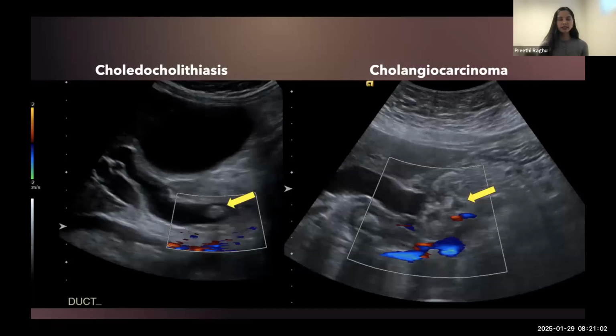So these are the pathologies that we look for whenever we try to follow these ducts distally. And like in these cases, if we get lucky, we can actually see that by ultrasound. For most patients, I will say, we won't be able to follow quite as distal because they typically have overlying bowel gas at the midline of the abdomen. So it may require further evaluation by MRI, MRCP in some patients. But for these two patients, we were able to actually figure this out by ultrasound.